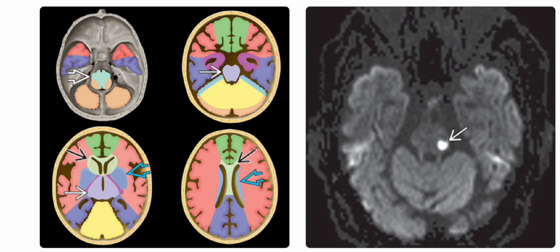Left is the axial graphic and it shows the major penetrating artery distributions, the pontine and thalamic perforating arteries, as well as the medullary perforators which arise from the vertebrobasilar system. The medial and lateral lenticulostriate arteries arise from the anterior circulation and they supply the basal ganglia. The choroidal arteries are shown in magenta color. Right is the axial DWI MRI sequence and it shows the diffusion restriction related to the acute ischemia in a pontine perforating artery distribution.